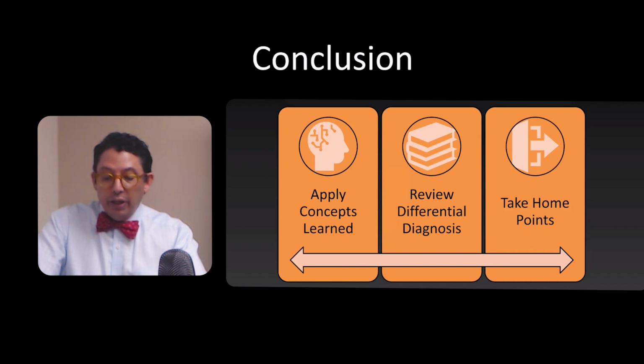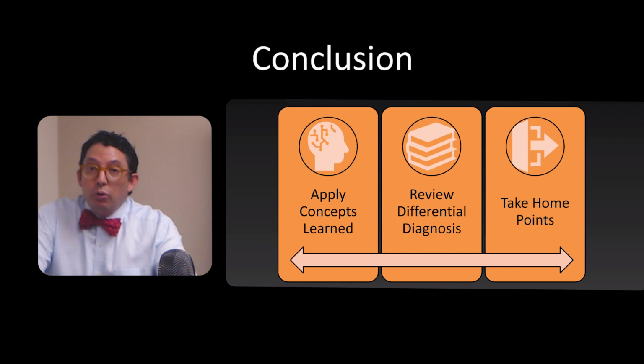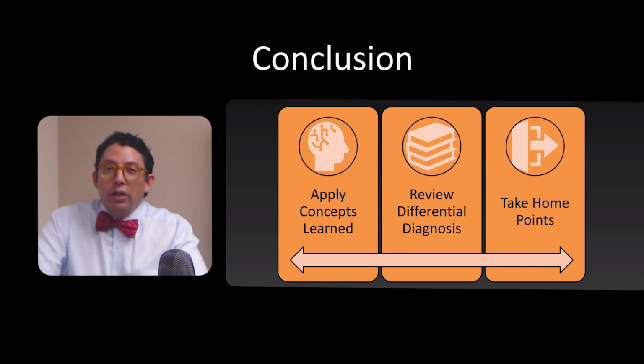And then, as take home points, I want you guys to remember to look carefully at all the windows, look carefully at all your trauma cases, so that way you can do the right diagnosis.